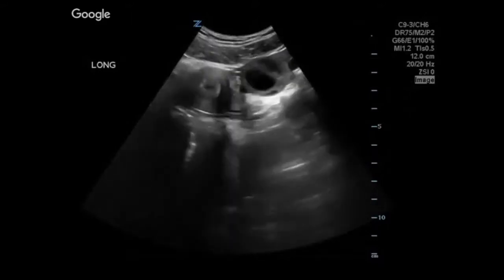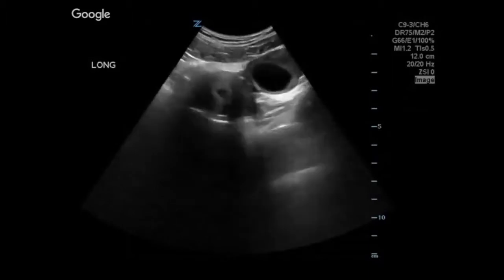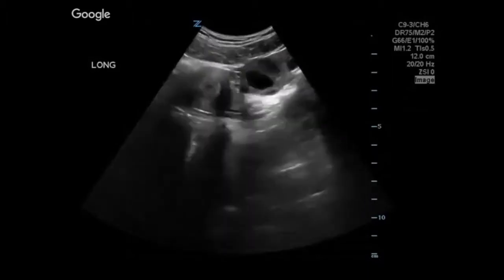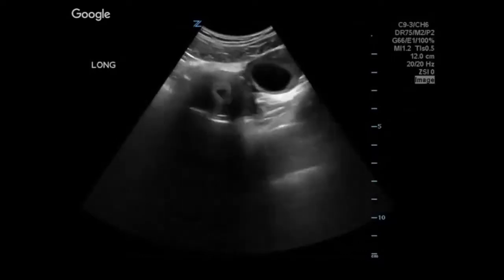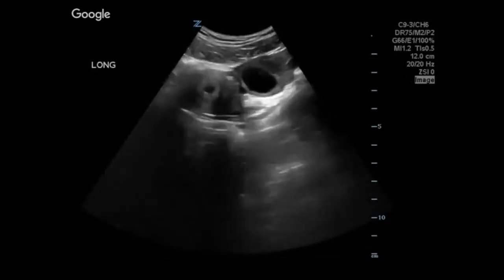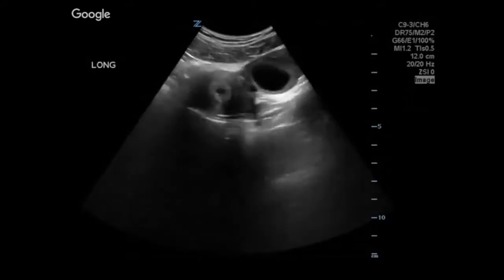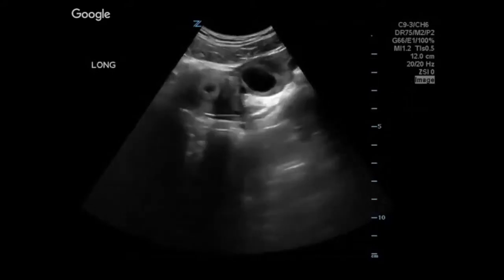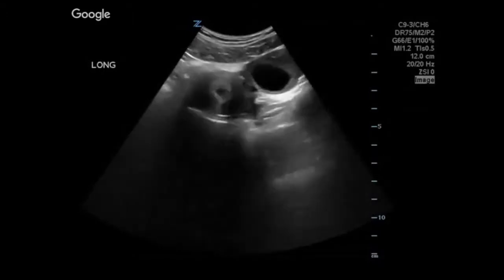It's hard to say because I would say it looks like an appy on the left side, maybe like the tubal. But again, it's a weird view that we're not used to seeing so much. The right side looks like some ovary, maybe, to me, but the left thing, I don't know exactly what it is, but for me it looks like it could be a transverse cut of an appy even. So I don't know exactly the scenario you see. Yeah, I'm not sure where they are.